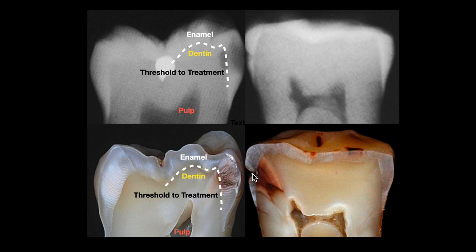Yet in real life, after the tooth has been split in two, we can see that the cavity goes quite deep, and we can even see some small thin lines of cavity heading towards the nerve, which likely means this tooth was already infected with the bacteria. And in order for us to remove this cavity, we have to cut quite a bit of the tooth out in order to keep it in there.